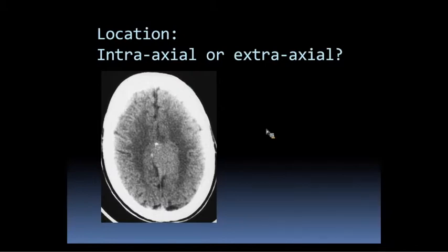No, because this is a little higher up, so we're kind of beyond that level. But I heard some people say extra-axial, some people say intra-axial. So it's clearly not always that obvious here. Here, this is cortex, and so the lesion is really inseparable from the cortex. So could this be a lesion arising from and expanding the cortex?